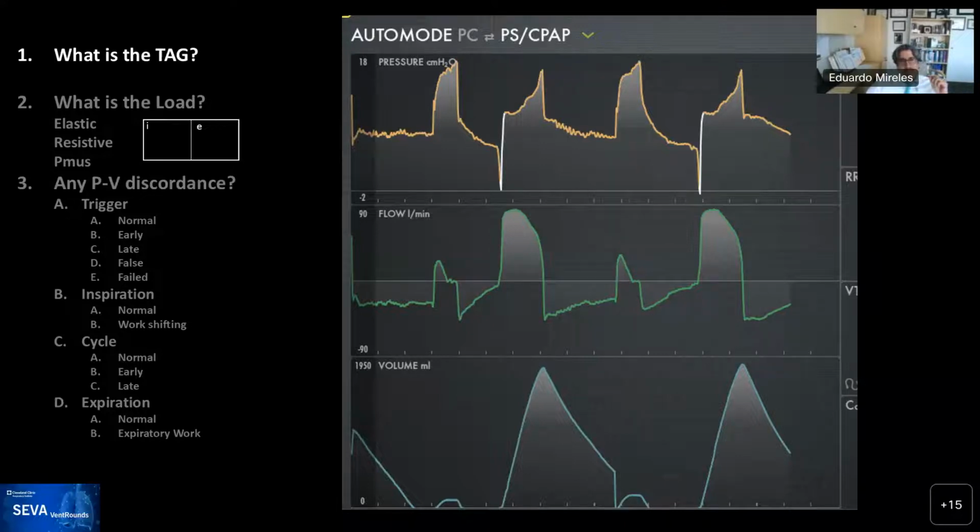I remember the first time I pressed this button, I still didn't know what it did. I had no darn idea what this button did, and in the prior model of this ventilator, there was even less guidance, and I pressed it and nothing happened. I didn't see anything happen, and I'm going to explain why. So excellent. Thank you very much.